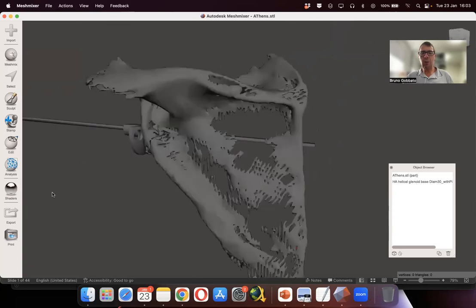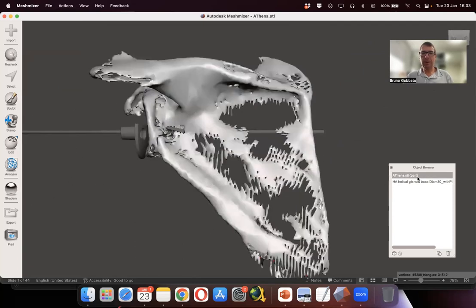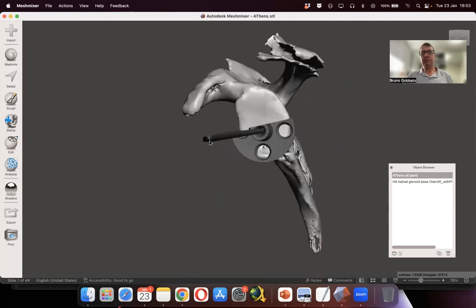So this is how we do our planning. Now we just need to export this planning and we have everything done. So this is how we do the manual version of the planning. And the good part of this manual version is that I can export this planning everywhere. I can export this planning to my smartphone. I can export this planning to VR glasses, to AR mixed reality glasses.